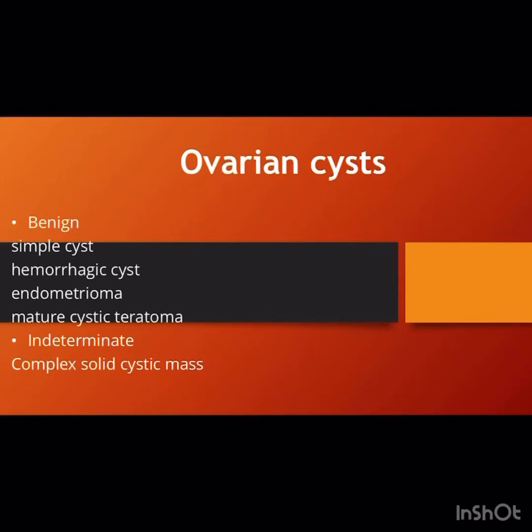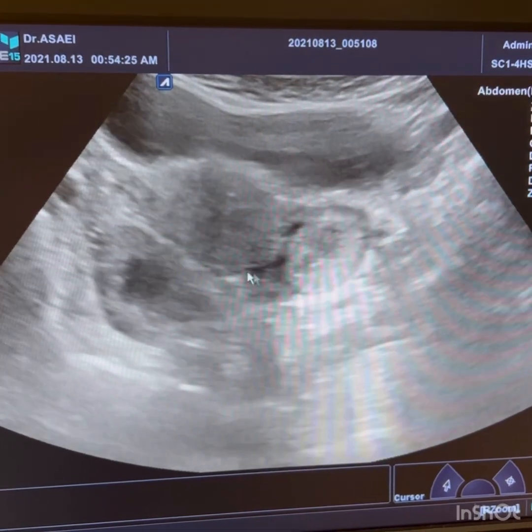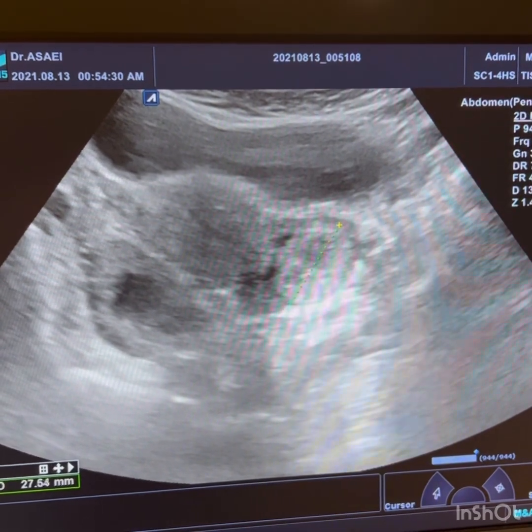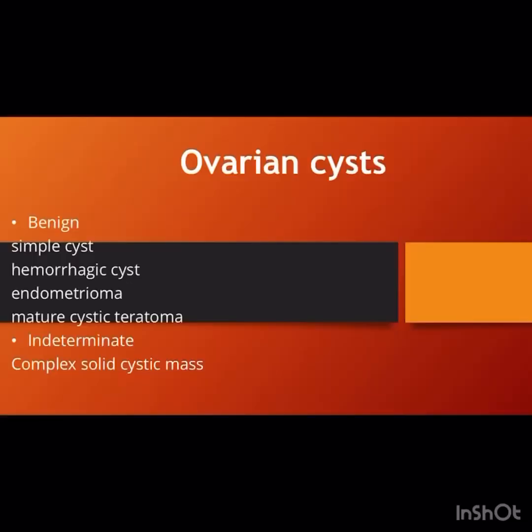In this video, we will discuss different ovarian cysts, their appearance in sonography, and how to differentiate them. And also we will discuss their significance and follow-up. Most ovarian cysts are benign, such as simple cyst, hemorrhagic cyst, endometrioma, and mature cystic teratoma. But complex solid cystic masses are suspicious and need follow-up.